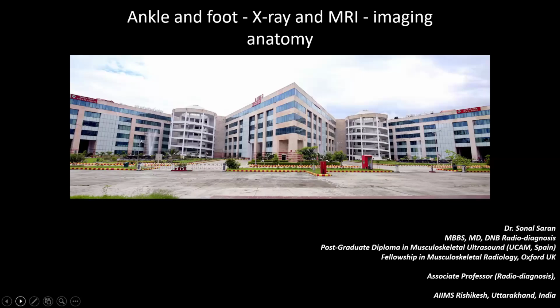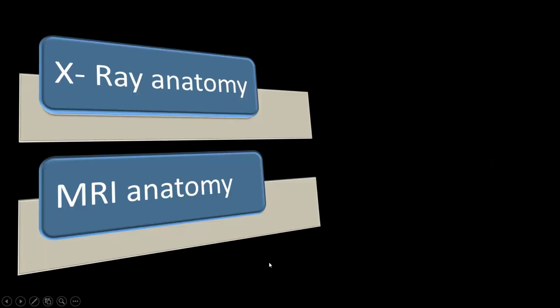Hello everyone, welcome back. In this video, we are going to study the imaging anatomy of the ankle and foot on both X-ray and MRI. So let's see. The flow of presentation would be that first we are going to study the anatomy of the ankle and foot on X-ray, followed by MRI.